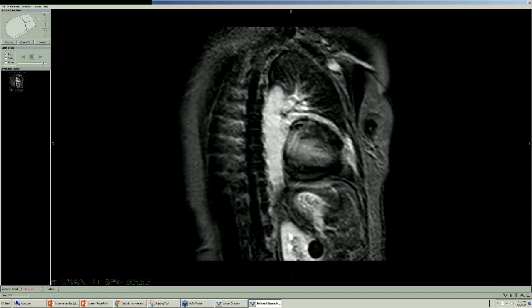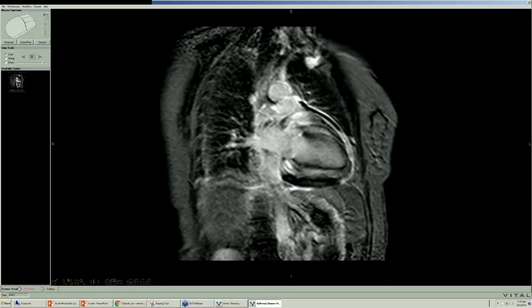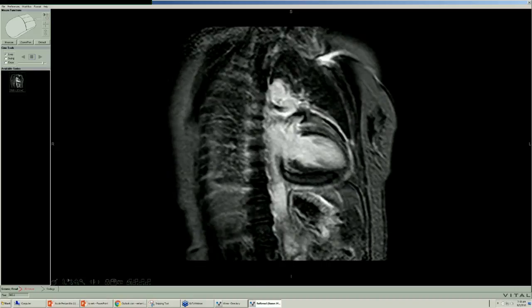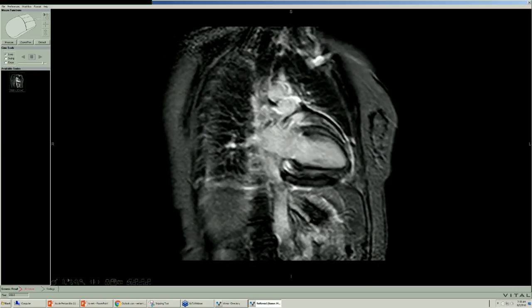And this is another image showing the myocardium and a fluid-filled space around the heart. And we see lighting up of the pericardium where it's actually white. And then we see the epicardium, the space, the shear surface is white.